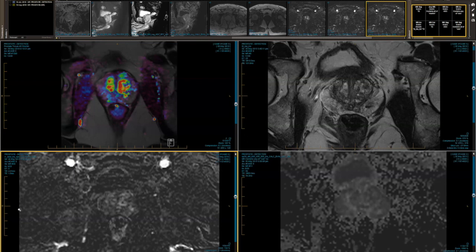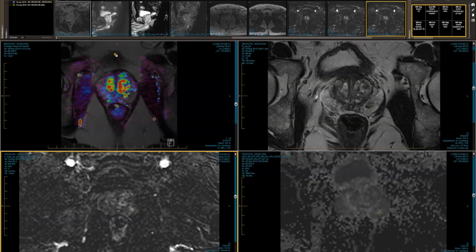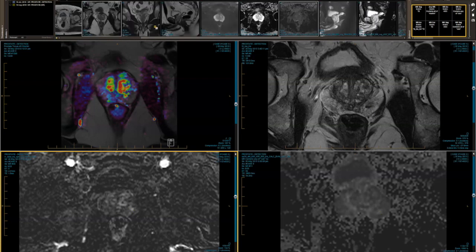So you can see that enhancing on that bottom left picture there, can't you, Richard? That's this one here. Bottom left. Yeah. There it is. All right. Well, he went on to have a biopsy, and Andrew can show you that.